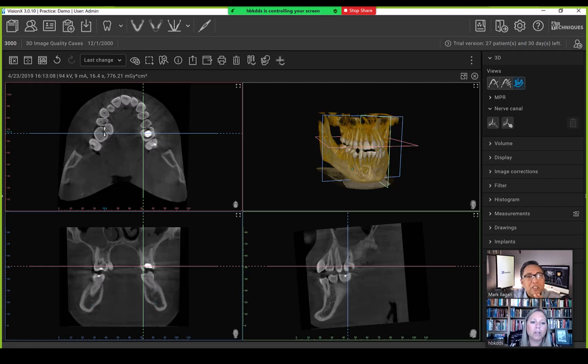Could you explain what that is? Yeah, so what happens is that the ray, as it's going around, will hit something that is metallic, and it will completely absorb all of those X-ray photons. And it leaves behind it kind of a black appearance. The algorithms are expecting to see something, and they don't have anything there. And so it makes it really dark there.